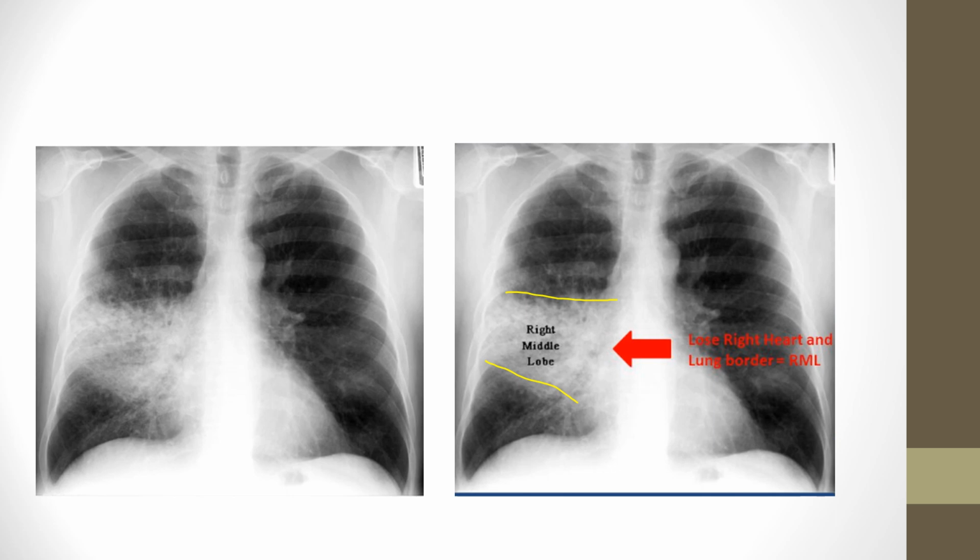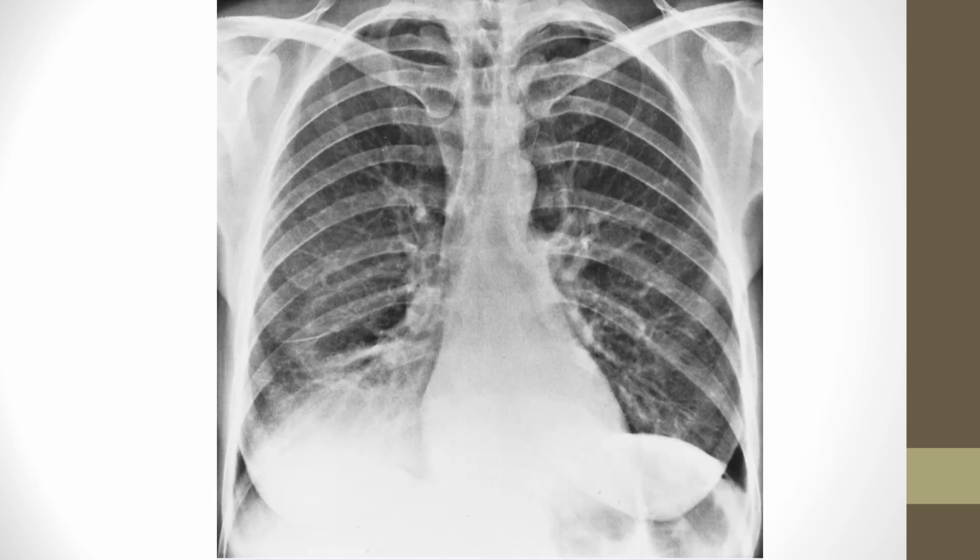And this happens with asthma too, where that whole right middle lobe will actually start to close down, but that's a whole separate thing. Not this class though. I can't go over that in this class, but if you want to look that up, pretty interesting stuff. So that way, this is a silhouette sign, right? Because it blurred that whole border. That's what we're seeing here.